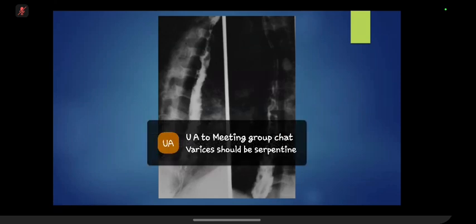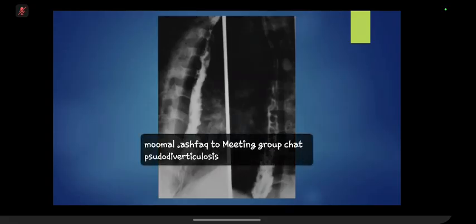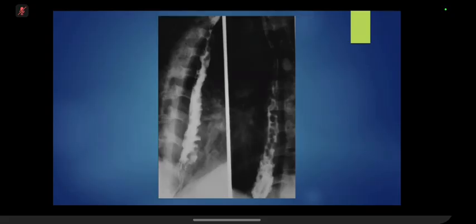Okay, so what would you like to do? In case it's candida esophagitis, I'd like to know the state of the oral cavity, whether the patient is a known candidiasis patient, which has led to this degree of involvement in the esophagus. Besides that, I would like to know the history, the immunocompromised status, whether the patient is diabetic. Okay, so you would like to know the history.